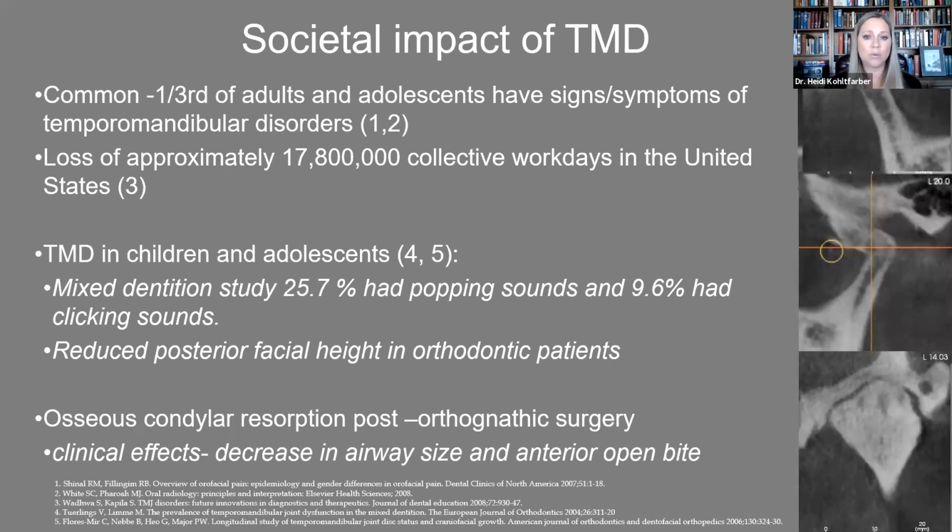So that's one thing we definitely want to look at: we want to monitor our condyles and make sure that our treatment for these patients hasn't caused another problem.